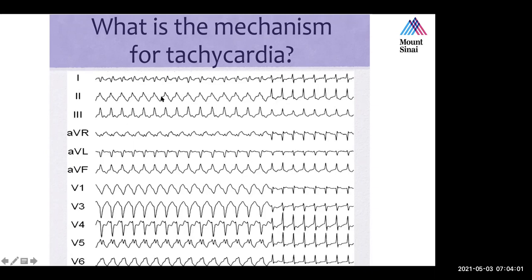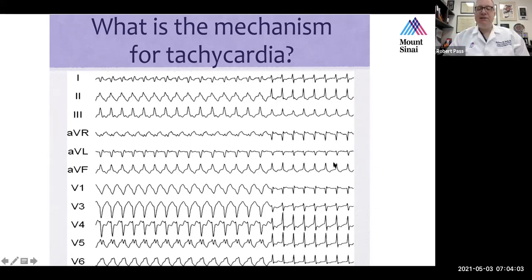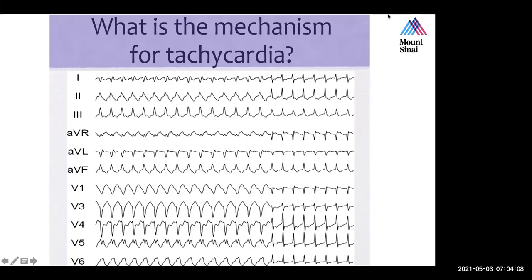So I see here, it's changing. 212, here, right, 214. How's that? Yes. So basically, the QRS morphology, as you pointed out, from the beginning of the screen to the end of the screen is changing. Based on the retrograde P waves that we are able to see, it's likely an ORT from a pathway, like a pathway mediated tachycardia.